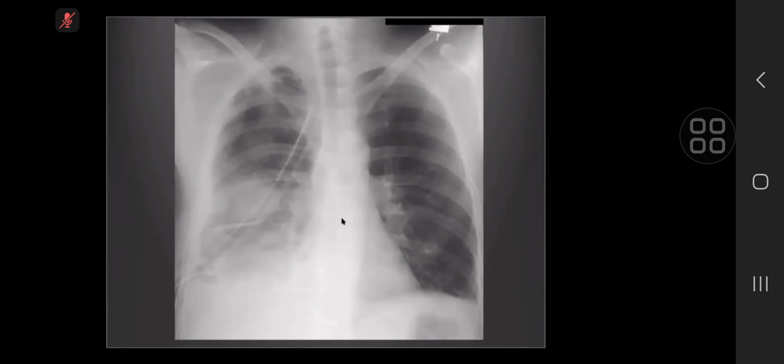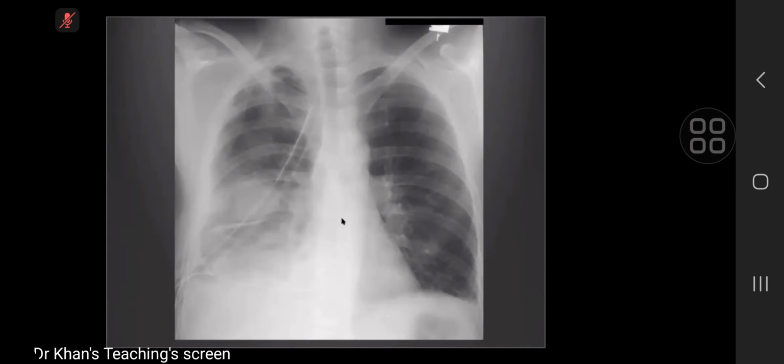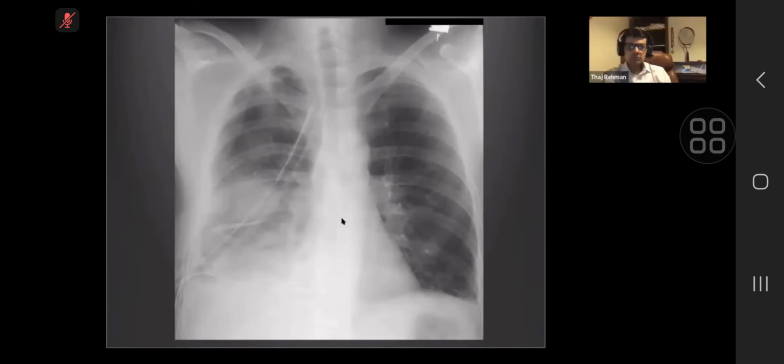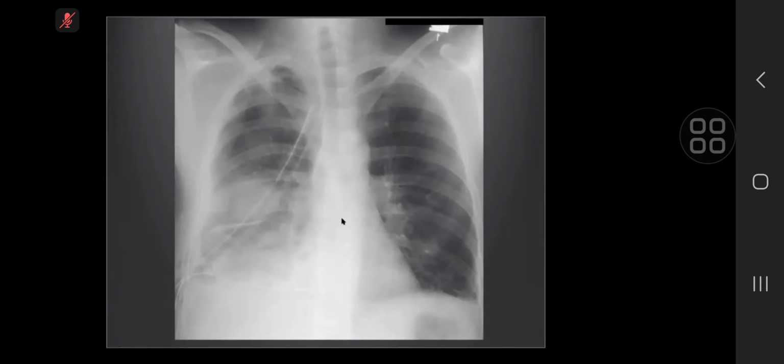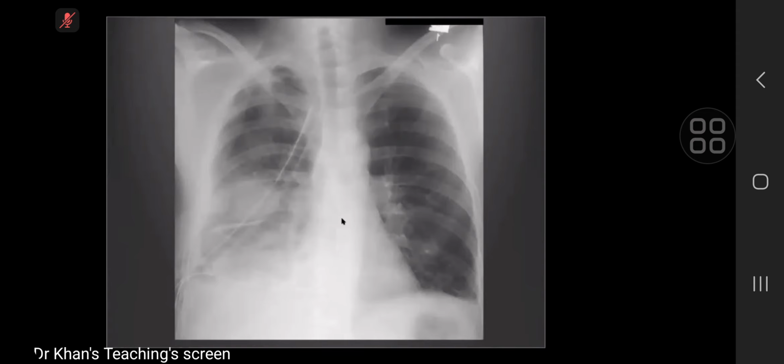So again, on this frontal radiograph, I can see there's a chest tube inside with its tip in the right paratracheal region, and there is a somewhat cavitating abnormal lesion in the right lower lobe. So I'm thinking it looks like the chest drain's been misplaced because the tip is not where the cavitating lesion is.